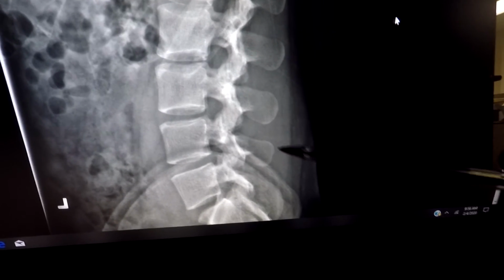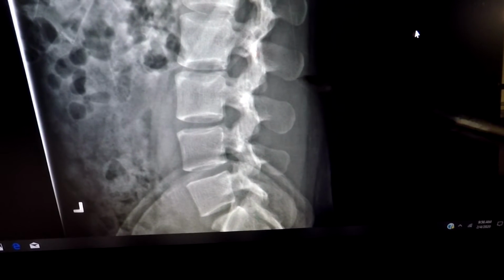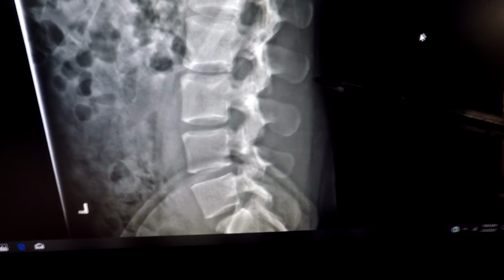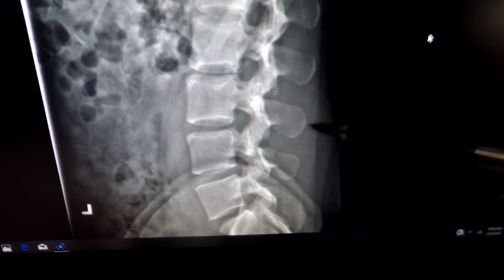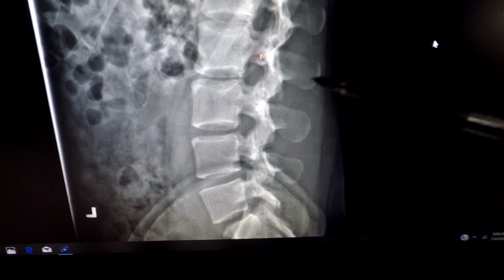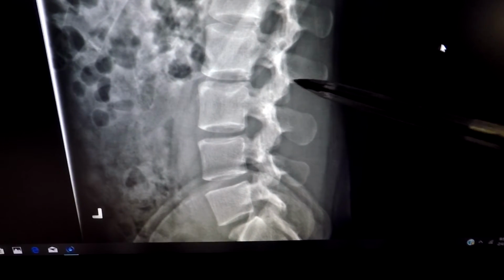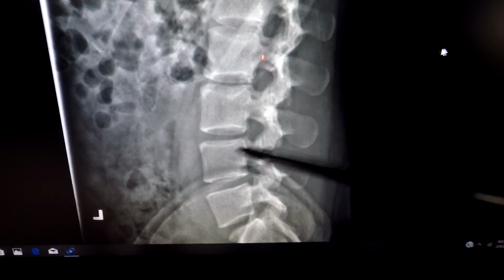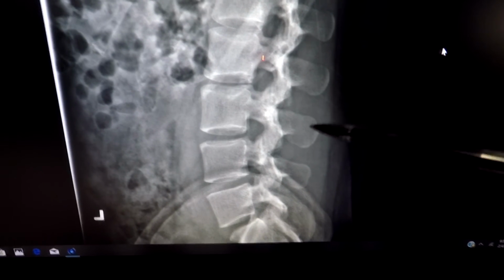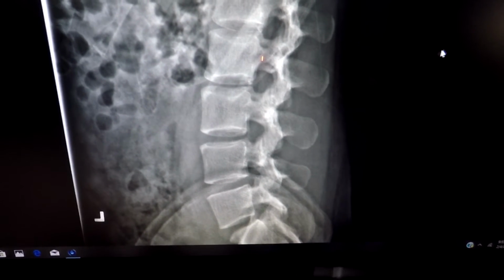Right back here, you can see these bumps. These are the parts of the spine that you can actually feel yourself. When a chiropractor is feeling the lumbar spine, we're feeling right in here to start. There are some ligaments that attach here, and very often when there's a misalignment or some type of abnormal motion, it will strain these ligaments between these two bumps, and you will actually be able to feel the tension in that, and that's kind of cool. So let's go back to this part right here.